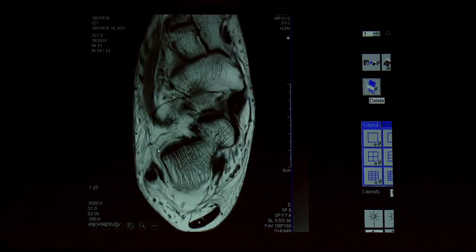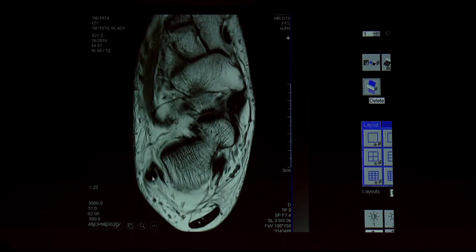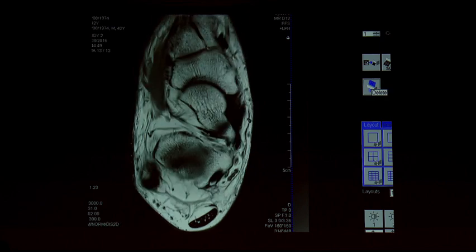Still I am going down. If I am carefully seeing, this is peroneus tendon. Along the inner side of peroneus tendon, calcaneofibular ligament. This is calcaneum, and this is peroneus, and this is the calcaneofibular ligament. You can see the attachment site over here. You can see typically, it will be seen between peroneal tendon and calcaneum. This is calcaneofibular ligament. So 3 high ankle ligaments, 3 low ankle ligaments.